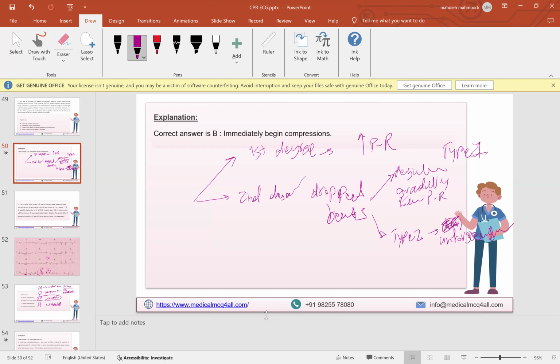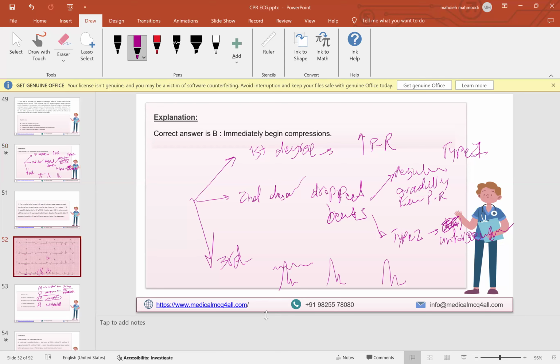You may have first degree or second degree type 1, but suddenly, or even normal PR interval, but suddenly there are some P's that are not conducted out of any order. That is called second degree type 2. And the third one is, of course, third degree or complete heart block, which means P waves are on their own and QRSs are on their own. So here, which type do you have?